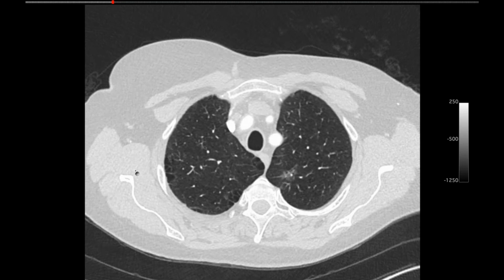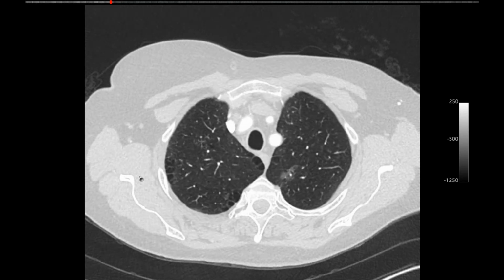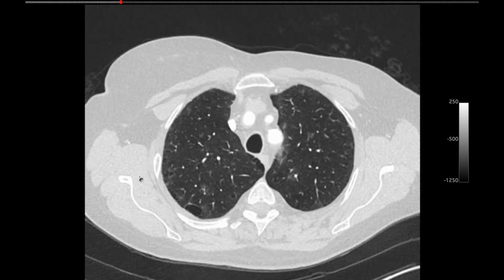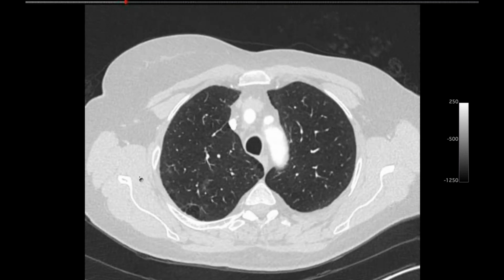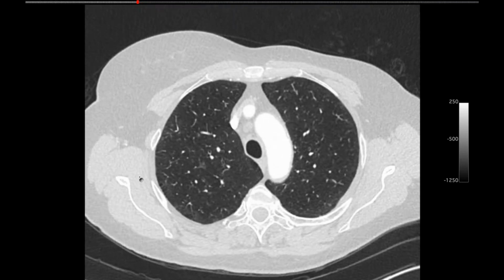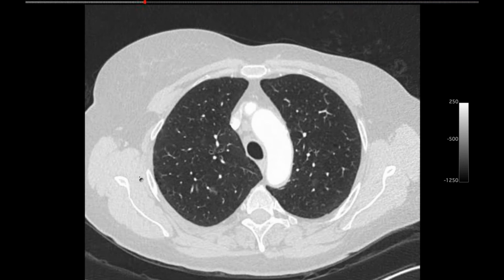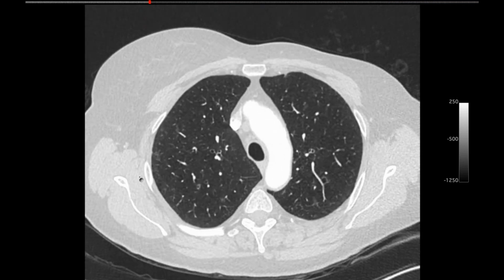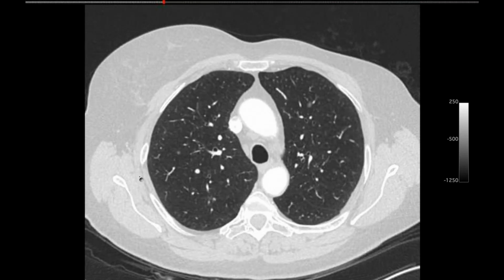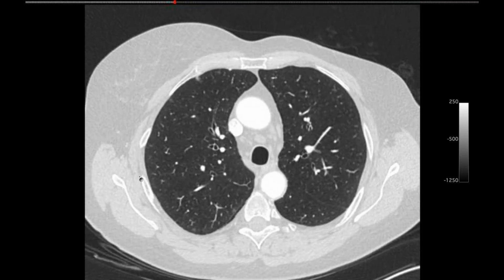At this point, there's no mystery about the bullae, but look at the lungs in general. And if I hesitate at one point, then I'm passing a lesion that I find particularly interesting. But I'm just going to scroll through there and give you a moment to make observations and decide how you would report a case like this.